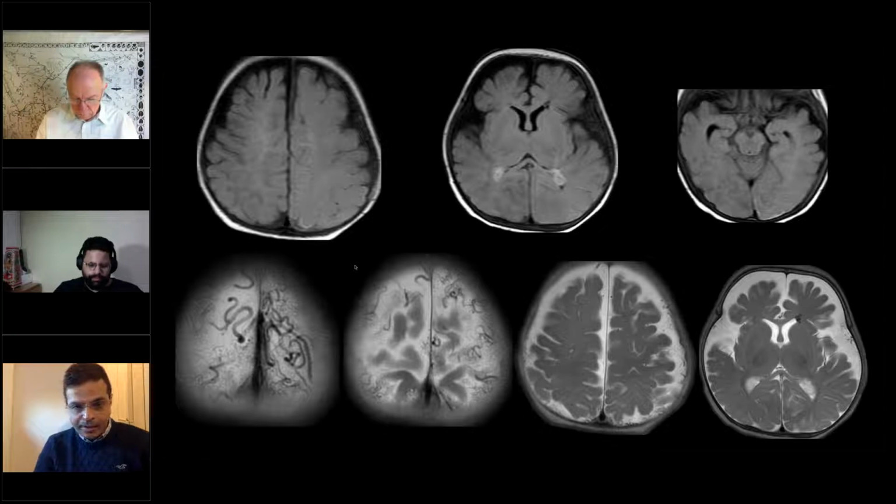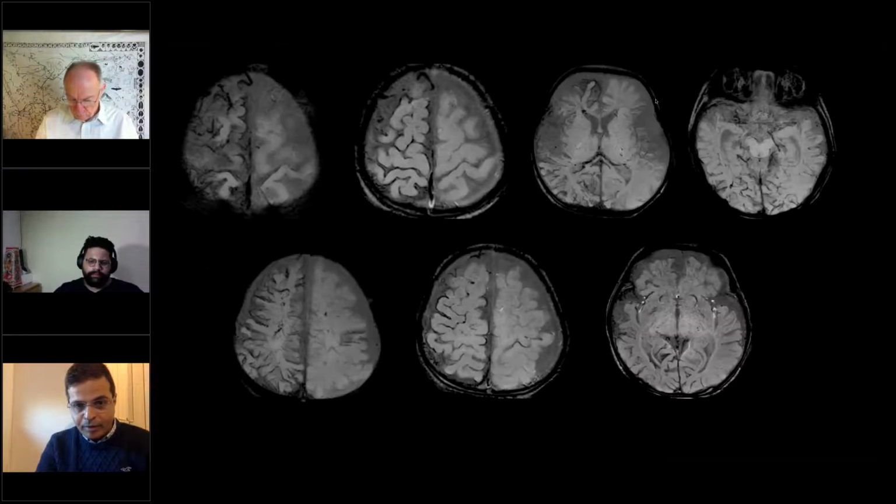In fact, in one of your pictures, you have the left frontal DVA, the developmental venous anomaly. It goes with the entire spectrum of these problems that happens. Okay.